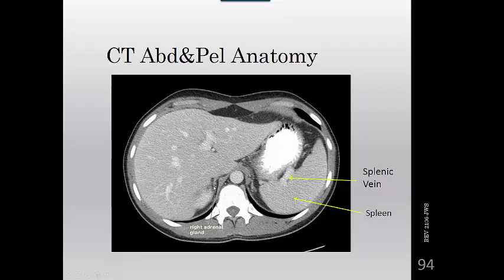Here is the right adrenal gland coming in right here, this little area, and it's got a different shape than all of it, but on different slices you can see how it's starting to form, whether it's going to be one of those four configurations. Crus of the diaphragm here and here. Probably going to be at the top of an adrenal gland here as well on the right side, left side.